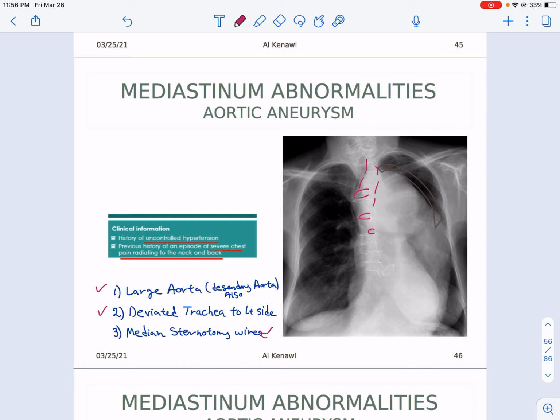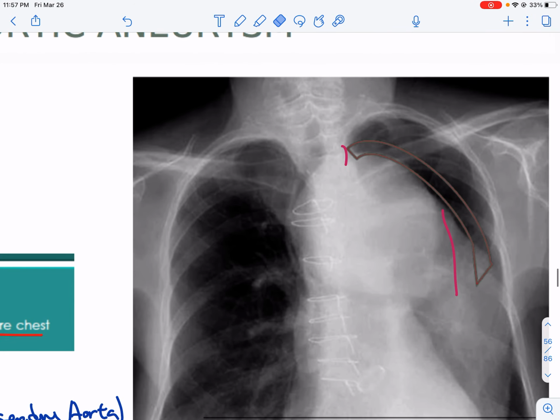This is just a finding, بس المهم عندنا إنه الأيورتا صار له enlargement، وكمان مو بس arch, it's also the descending aorta مع deviated trachea حنقول إنه هذا basically aortic aneurysm. إذا قادرين هنا تشوفوا كيف صار للتراكيا deviated to the left side.